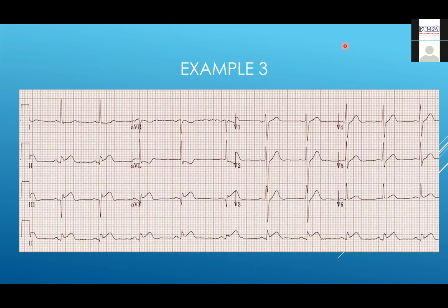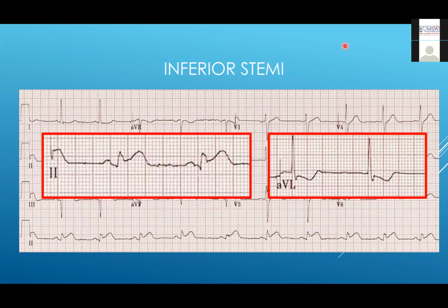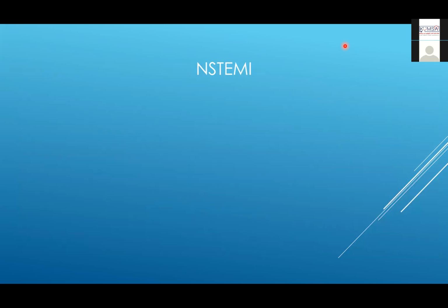Okay, so that's just a closer look. I put some close-up images because I wasn't sure that the quality would be beneficial in Zoom. For non-STEMI, I didn't include any ECGs. We saw ST depression in the previous ECGs that I showed, but it's also important that if you do have or assume that you have ST depression in certain leads, it's always important to look for ST elevation elsewhere. It's only when you've made sure that there's no ST elevation elsewhere that you consider this a non-STEMI.